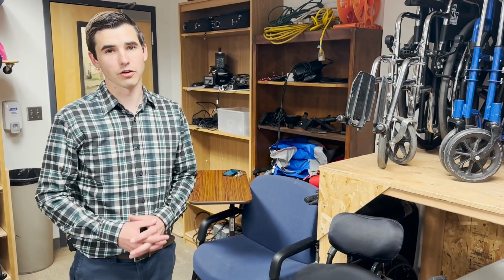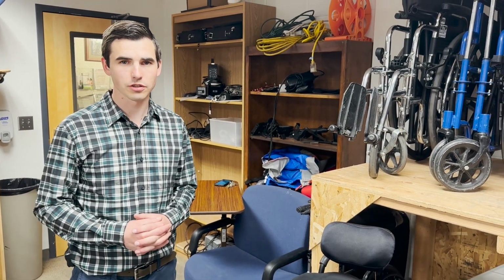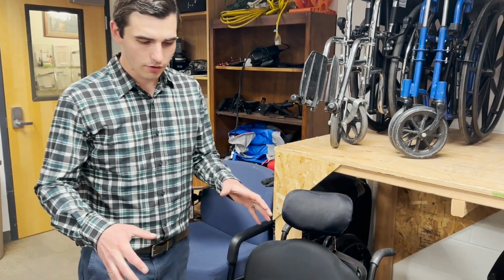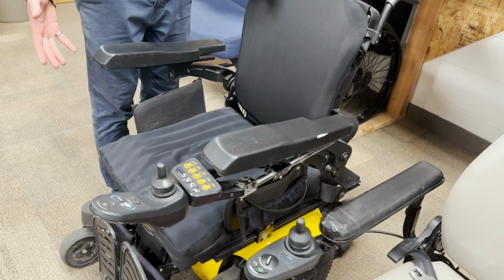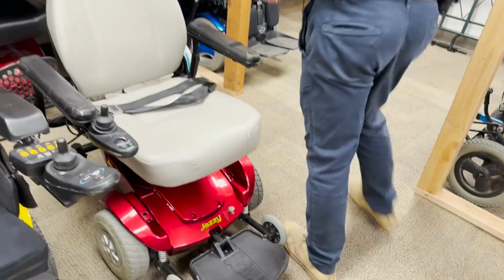Okay, next we're going to talk about power wheelchairs. This is more of a category of a person who doesn't have the strength to be rolling around in a manual wheelchair for extended periods of time especially. This power wheelchair here is designed for someone who's living in this wheelchair for most, if not all, of the day long. This wheelchair over here is for someone who is living in it for parts of the day or can still shift around or stand up or other things.